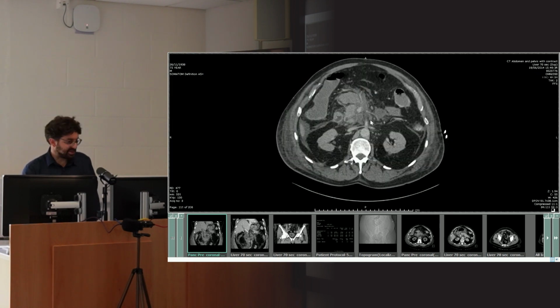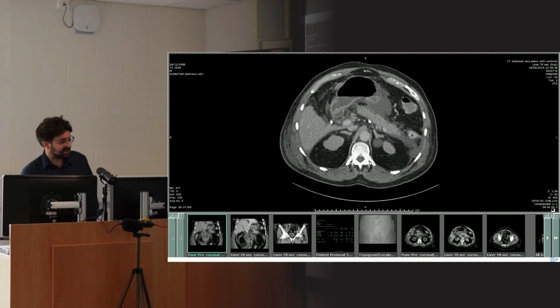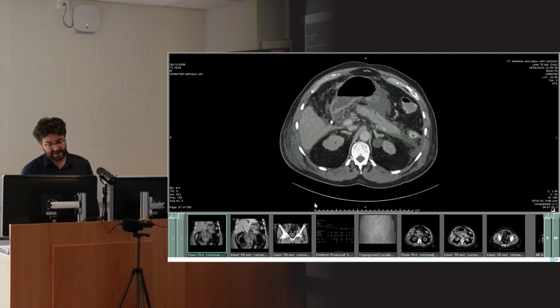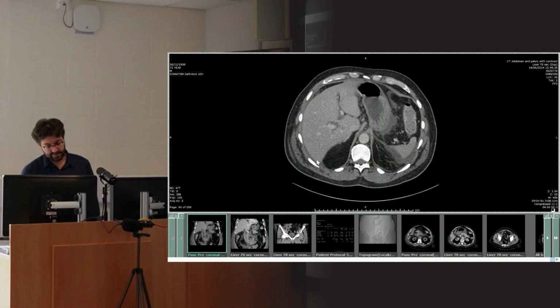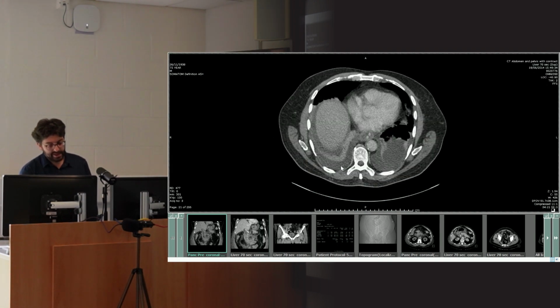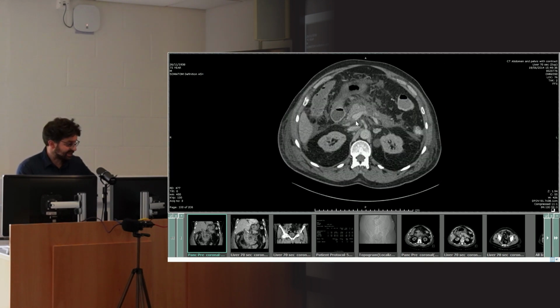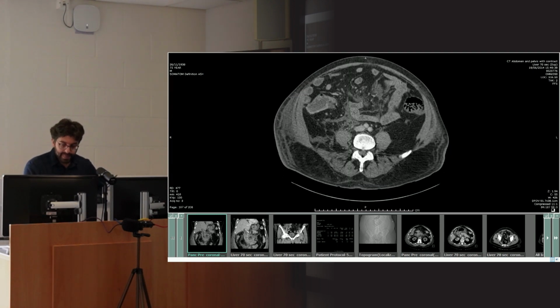This fluid should be in the intravascular space, but it is not. This is also the reason why pancreatitis patients get sick and go into organ failure, because they deplete their intravascular volume, because all that fluid is now sitting here within the peritoneal cavity, and here within the flanks, and here within the pleural effusions. So another great thing about radiology is you can quite literally see pathophysiology in action. You can already tell just by looking at this patient that this patient is sick. They've got loads of third spacing going on, loads of fat stranding everywhere.